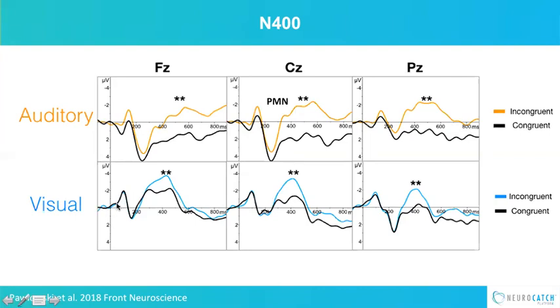Again, we see the flat line, we see the sensory perceptual waveform. But then notice that we see a much sharper peak, because the information is not being processed in speech over time, but rather we can access it much more rapidly. And so the N400, when we present it visually, is a fundamentally different peak. To drive that point home on this slide, we don't see any speech-related activity. We just see one peak rather than multiple peaks embedded in the same waveform. And you can see that here.